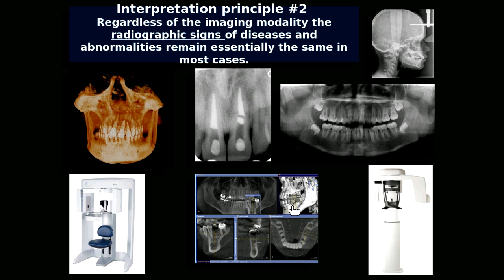Also in CBCT, if there's an area where you want to check for implant placement, if you want to see the bone height and bone width, you can easily check it by using your cross-section images. In this case, we were thinking they may not have enough bone, but we went through the CBCT scan and measured towards the number 19 area. We have enough bone, good bone and good width too. So we decided to place an implant in this area.